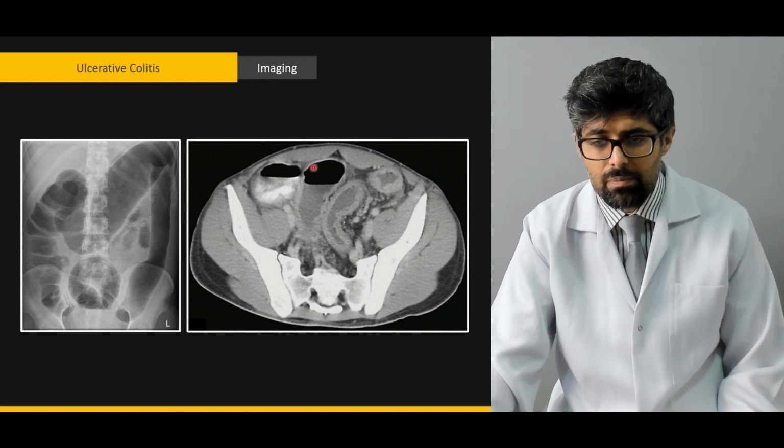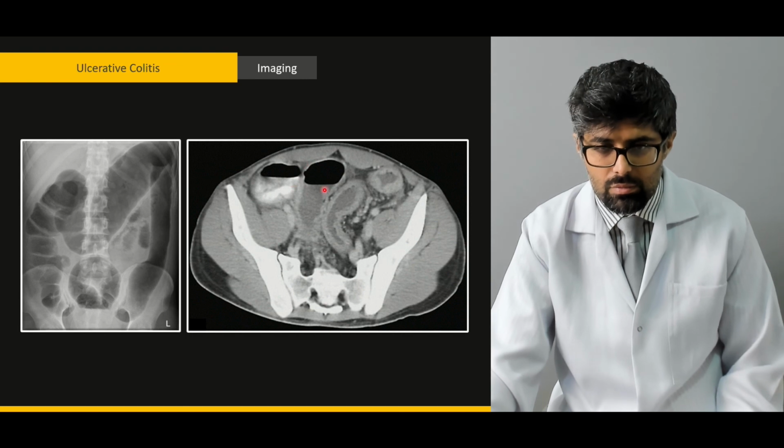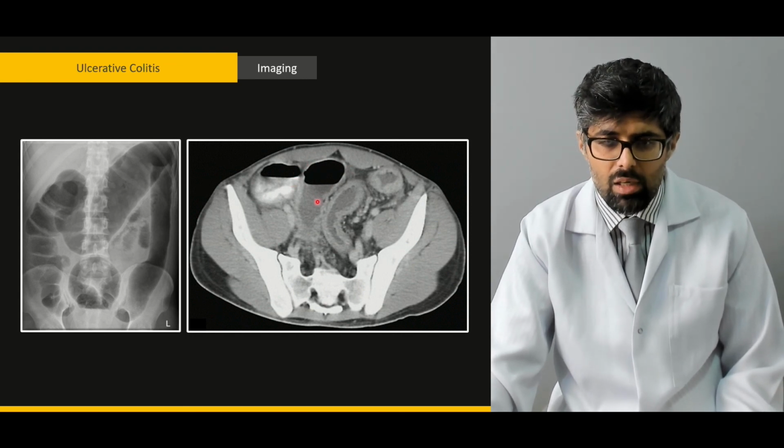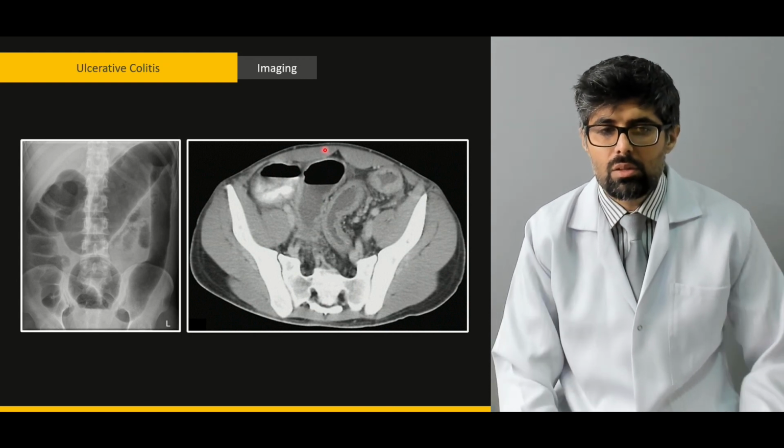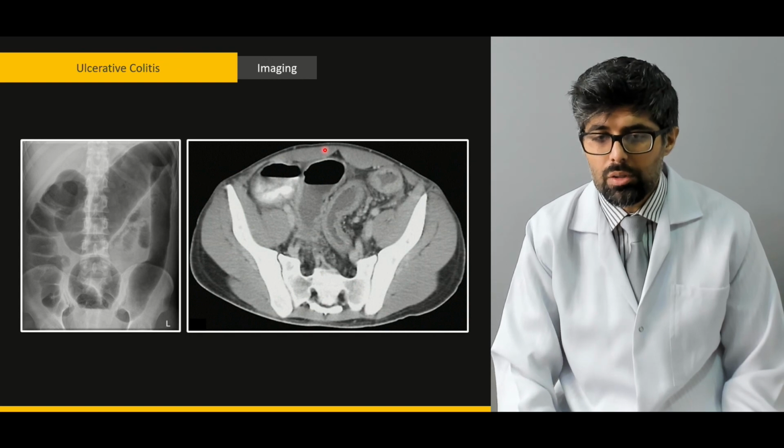This is the thickening of the mucosal membrane and the presence of air inside the colon.